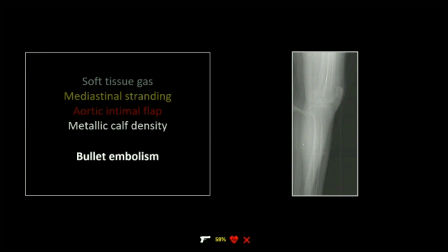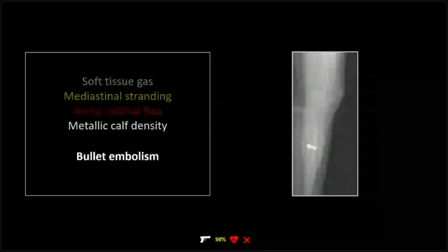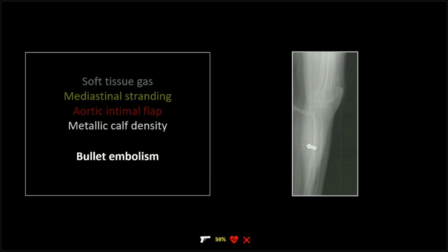But this patient happened to have had a whole body lateral view scout. And there it is. And by pellet, they meant BB. I always think of those as BB guns, but this is what they had meant. This patient was shot in the chest with a BB gun. When I looked at this, I thought, thank God for that brilliant tech. The tech is omniscient, prescient, clairvoyant. How did they know?